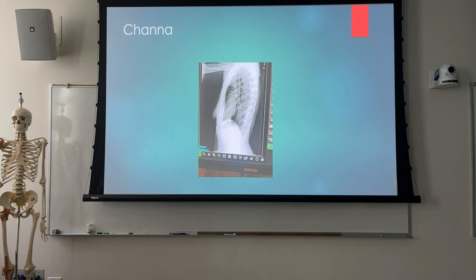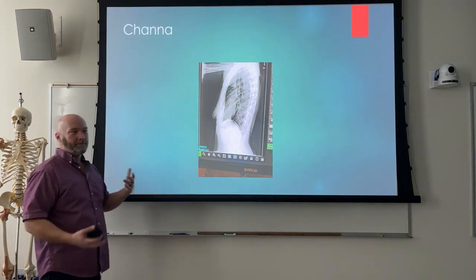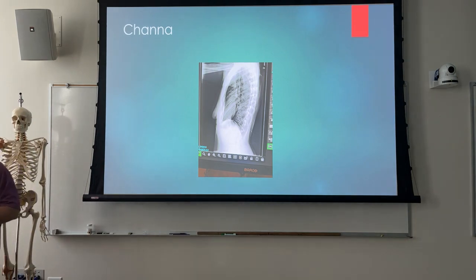So, is that a repeater? Well, consider all things. I mean, can you see what you need to see? More than repeat, what you need to do is learn from what you've done before, right? Can that be improved on? Absolutely. So you have this patient again, their lungs aren't that long. You might know if the patient can elevate their arms better, and you might know from the PA whether or not we've got any kind of rotation. So on the repeat, maybe you could make a better image.